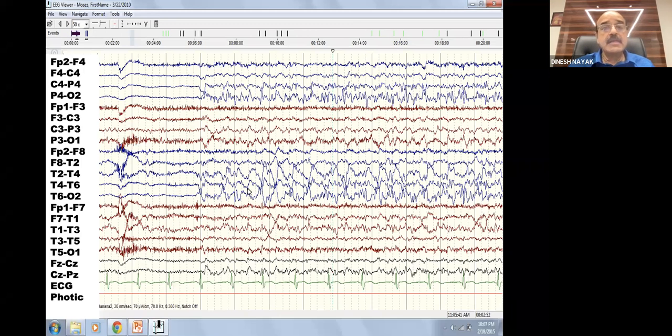And this is another, the same patient. You see, it's evolving very nicely from this, which is the previous page. You can see that the seizure started off with high frequency, continuous activity. So the PLEDS has now evolved. This is called evolution of PLEDS into a seizure.